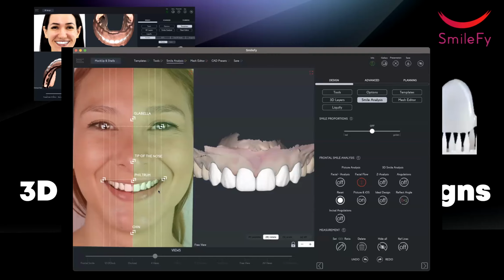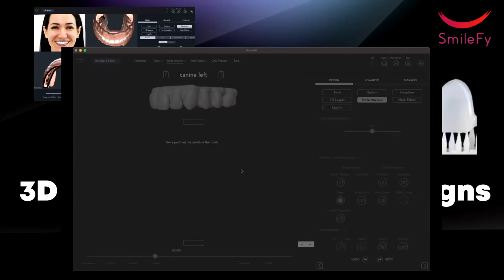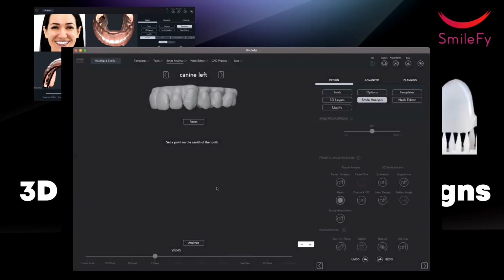If you design towards the red, then you create a visual tension in the face by crossing lines, because the chin goes to the right, the smile goes to the left. You have crossing lines in the face, it's not considered in harmony with the face. That's one. Zenith analysis, a very interesting and very powerful study.